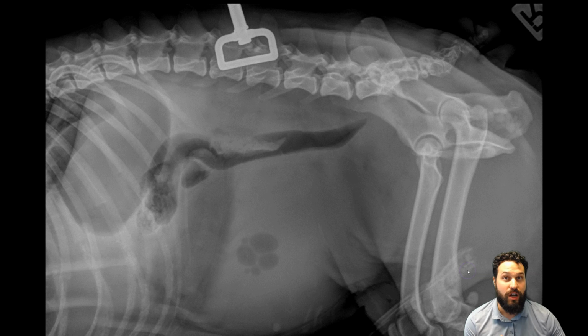This patient has a lot of calculi in the urethra, and so it becomes a little bit easier to see. But you can imagine that only one or two, which might still cause an obstruction, could lead us to maybe not identify that as well.